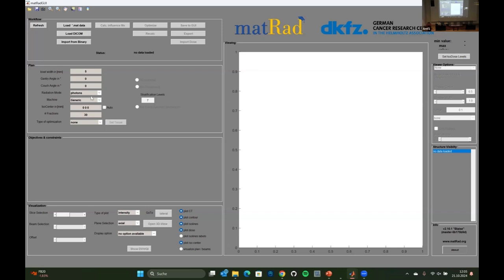So you have basically the ISO center here. You can set the number of fractions for your treatment. You've also already learned that people come multiple days for a treatment, and some other stuff here will become clear later on. This will also fill up as soon as we have a patient or some form of phantom loaded. You have some sections here to steer the visualization.